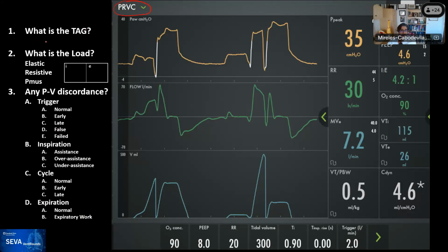Very rapidly, good job. So it's pressure control, CMV, and A. And this is relevant for what you're going to see right now. Pressure control essentially means that we're controlling the pressure during the breath. People may tell, you can see how beautifully it controlled the pressure here, and here, and here.